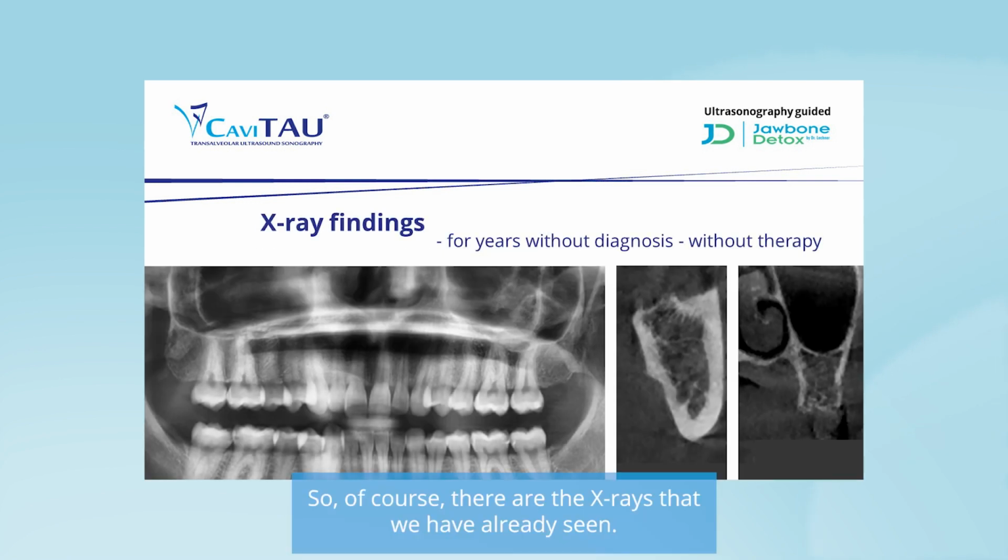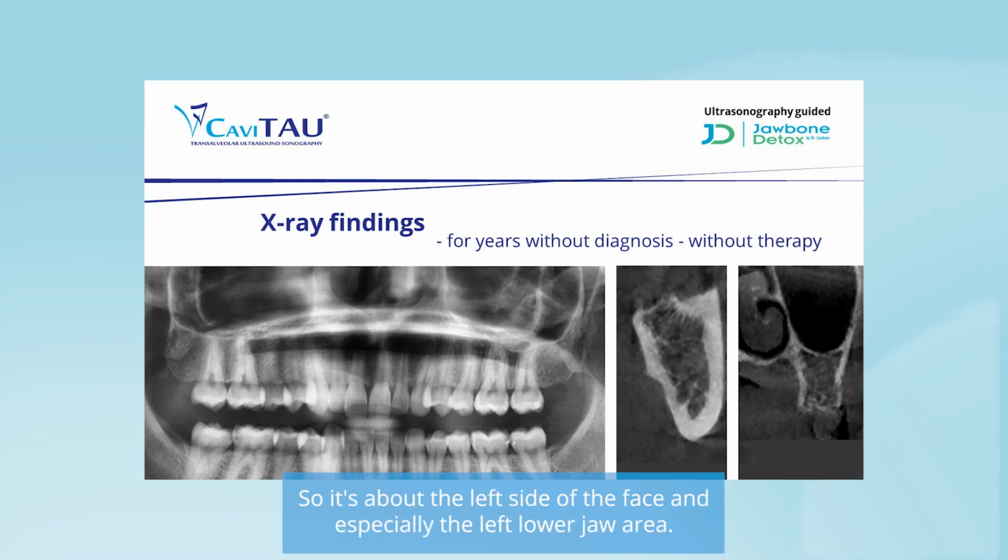So, of course, there are the x-rays that we have already seen. So, it's about the left side of the face, and especially the left lower jaw area.